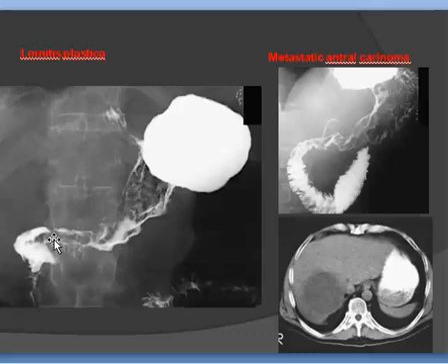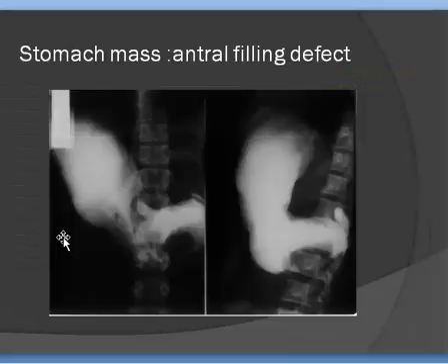Again, another case of linitis plastica. Here it is due to metastasis, as there is metastasis in the liver and the stomach as well. So we have deposits in the submucosa and we have deposits in the liver, and here we get linitis plastica involving the body and pylorus.